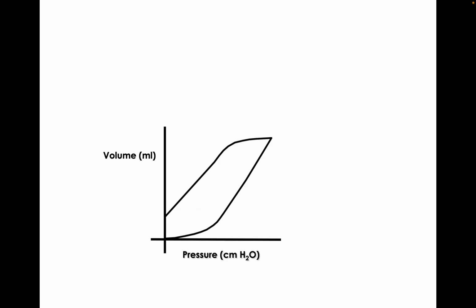Now in this particular PV loop, you could see that inspiration is quite okay, but the expiration is not touching the baseline. So in this kind of loop, there is no air which is counted, so probably there is a leak. This is classically seen in air leak.